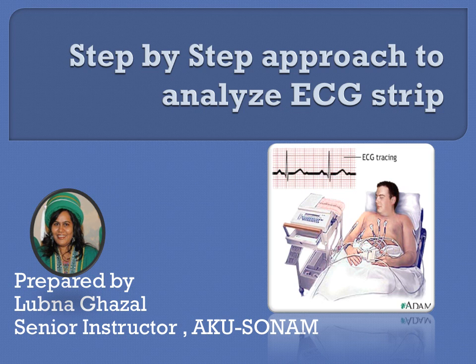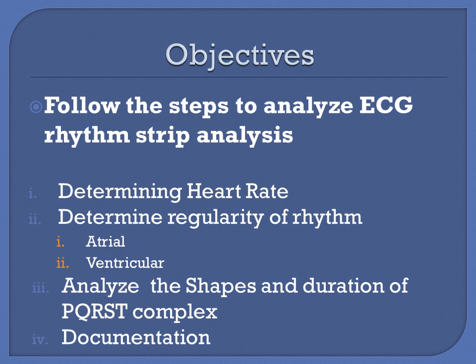Hello students, in this lecture we are going to focus on a step-by-step approach to analyze an ECG strip. These are the objectives of this session. In order to analyze ECG rhythm, a step-by-step approach is required. So following are the steps to analyze ECG rhythm.